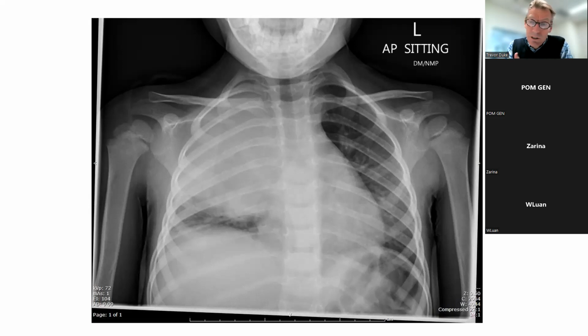And the other way you could do it is do an ultrasound to look at whether the lung structure seems normal, whether there's a mass associated with it, or even do a CT scan. You could do. But I think your suggestion, Benji, is quite practical, and that is to drain the effusion that's there, and then do another X-ray to see what is left afterwards.